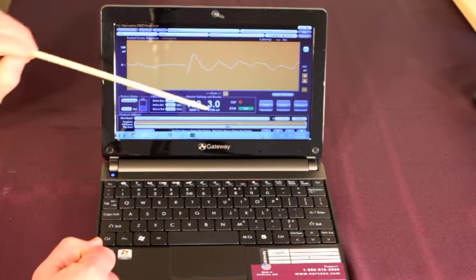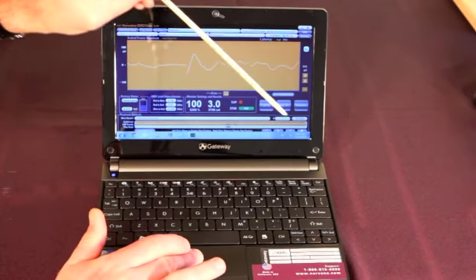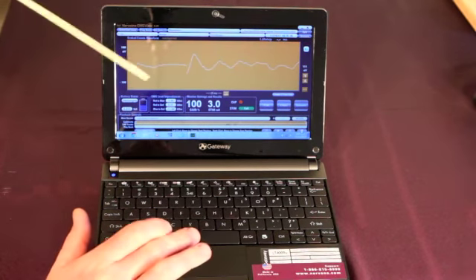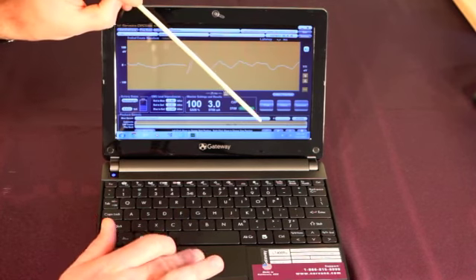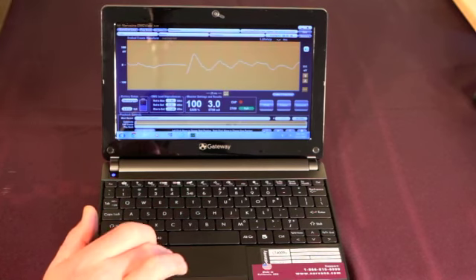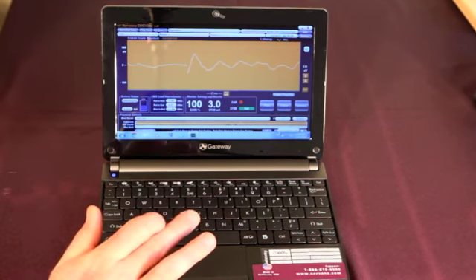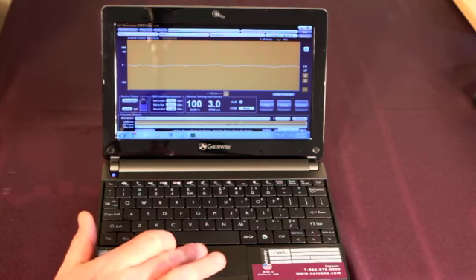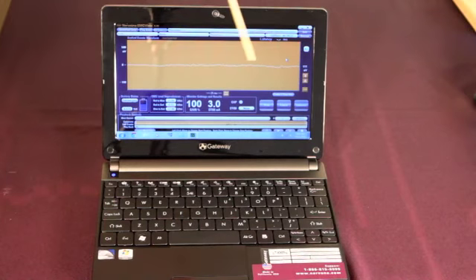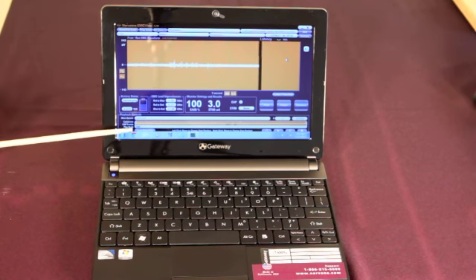The last thing I want to show you is how to reset the start and stop points. Let's say now that I would like to go back and review something from the beginning of the case. The way I'm going to do that is I'm going to click stop. You'll notice that when I do that, the blue bar disappears. That allows me to reset my start and stop points. I'm going to go to this first control button over here in the Playback Controls. It's an arrow in the shape of a circle. When I click on that, the start and stop points are reset, and when I click on the play button, you'll notice here now I'm seeing data transmitted, the line's beginning to move, and my blue bar starts advancing now again from the beginning of the recording.